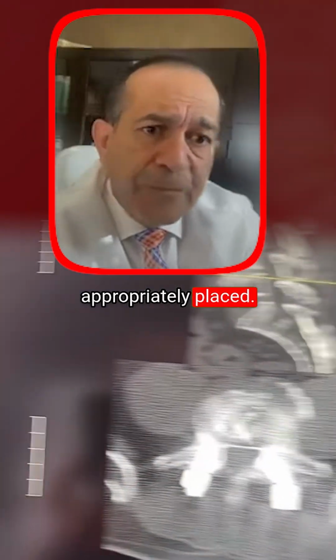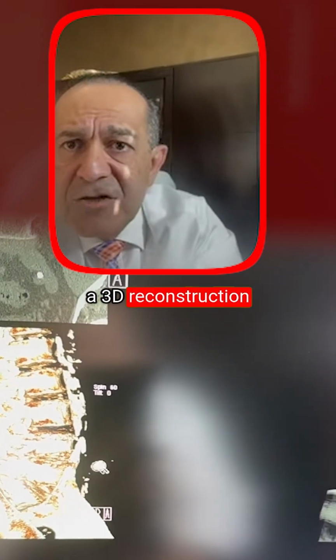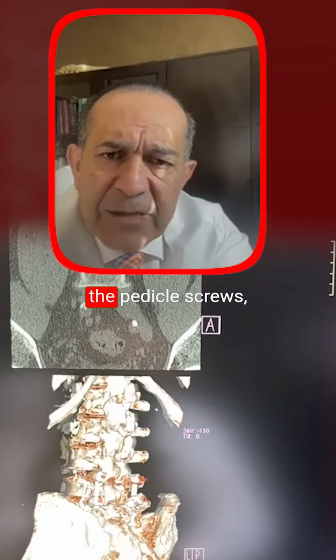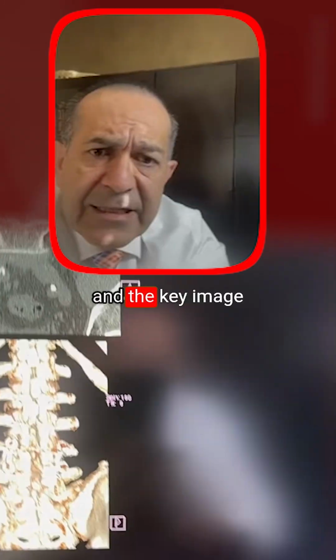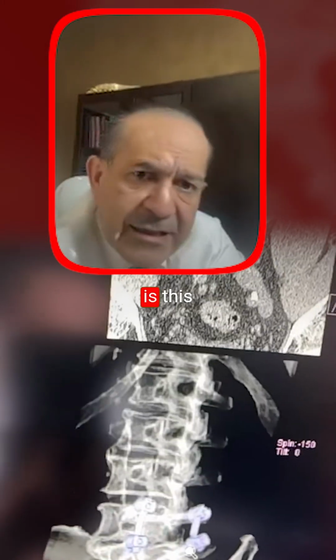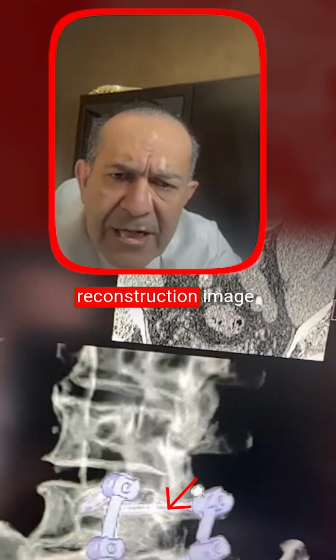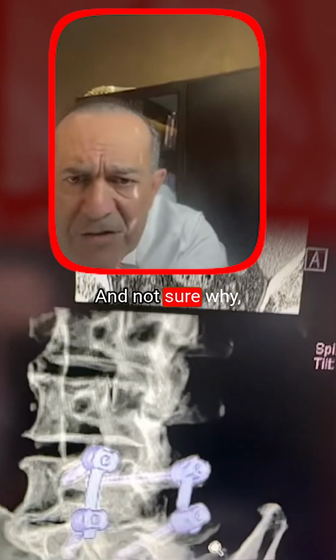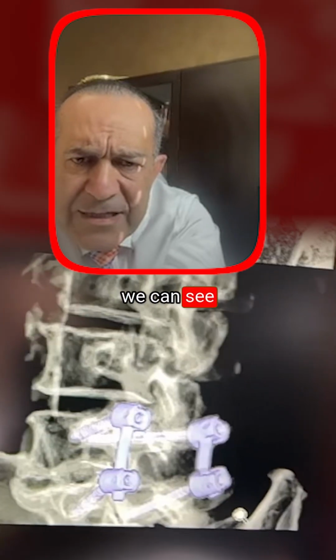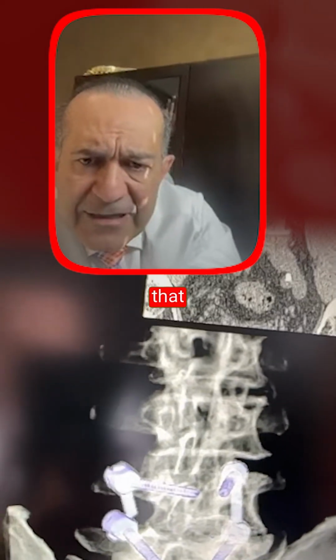appropriately placed. This is a 3D reconstruction CT, and here we can see the rotation of the spine, the pedicle screws, and the key image is this reconstruction image, and not sure why, but the radiologist did not pick up on it. And here we can see that this interconnecting rod is broken.